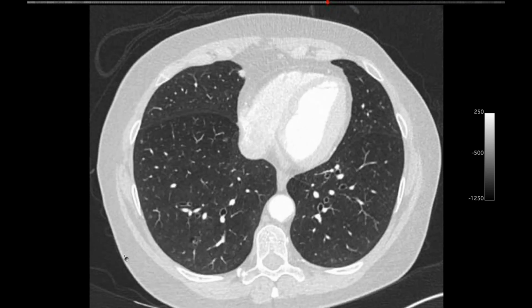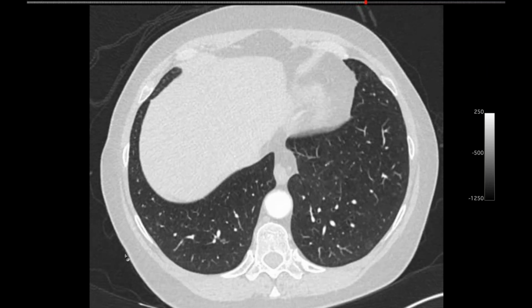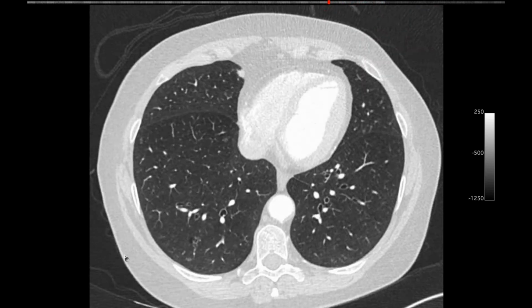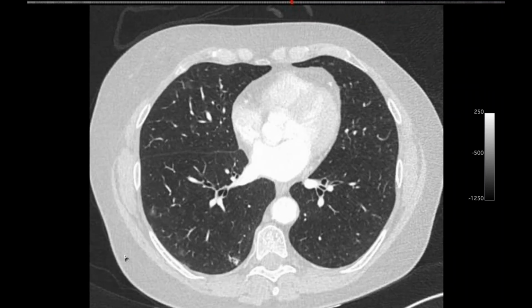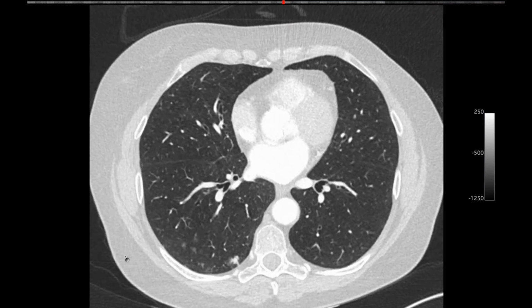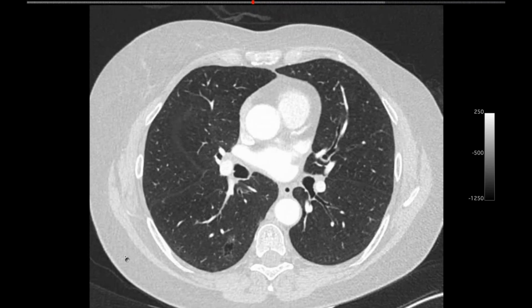I'm only pointing out a few selected interesting things in the lungs that are very, very abnormal. So, having scrolled through there relatively slowly, any comments? So it looks like each individual one you showed, some of them look like typical part solid, part cystic lesions that are classic for adenocarcinomas. And I think you're showing a nice example of multifocal, separate primaries, the field effect.